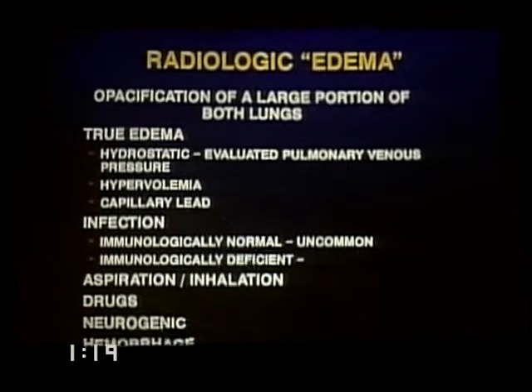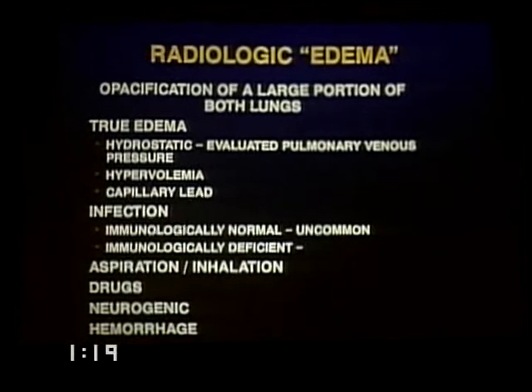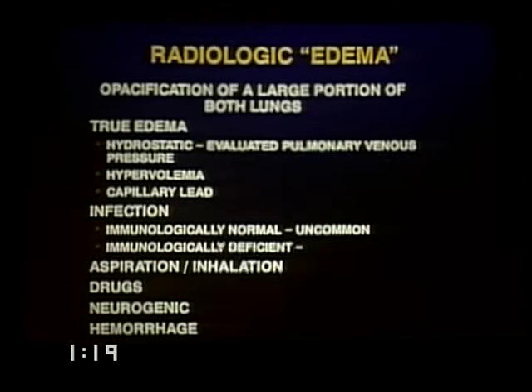The other edema, I showed you this in interstitial as well, is the capillary leak. Now, the capillary leak edema is divided into various stages into which we need not go. But in acute exudative edema, the alveoli may flood to a very considerable degree, and it may be indistinguishable from classic airspace edema. The big distinguishing mark, of course, is the multitude of air bronchograms.